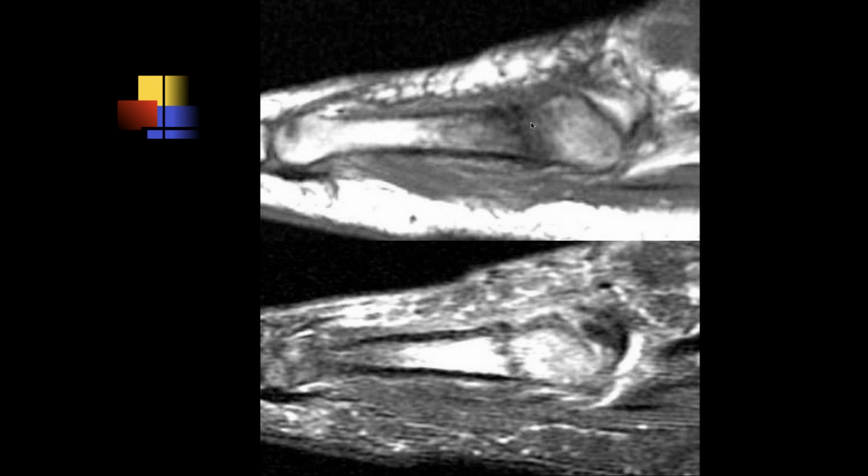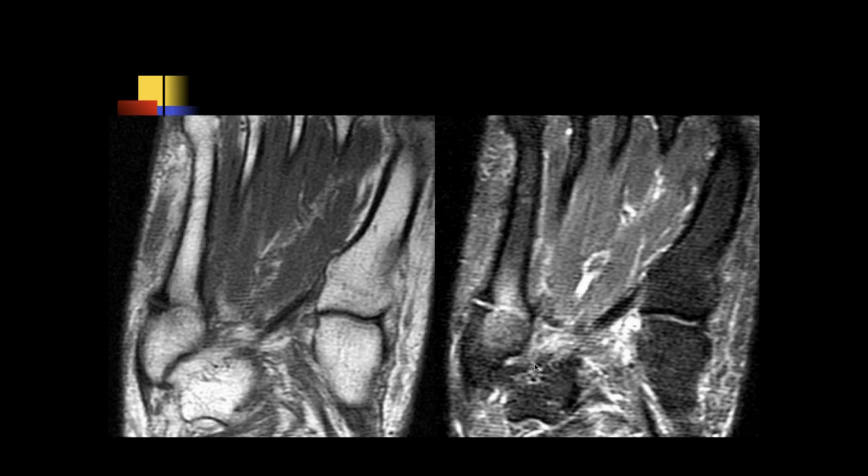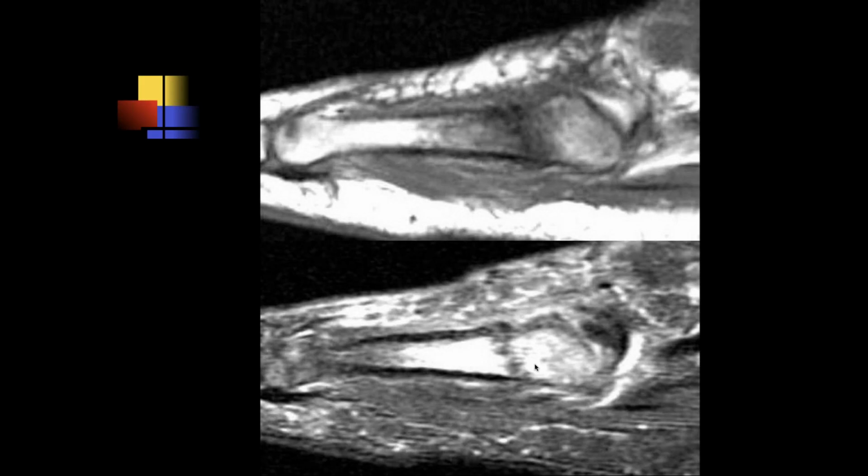And this is a little bit distal for the typical Jones fracture, but again, it's in an area of high risk. No, I don't think so, John. I think that's a Jones fracture, don't you? Yeah, as I said, it's kind of in the distal aspect where you could call it a Jones fracture, right? Yeah, it's right at the junction of metaphysis and then diaphysis.